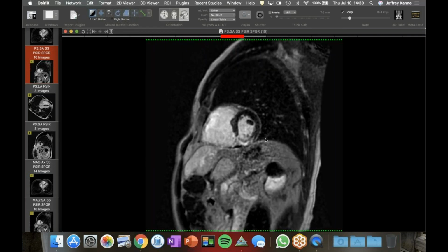So it's both on the pulmonary arterial side and the systemic arterial side. And that was a thrombus on the right atrium. So this patient had been on anticoagulation for a long time. So even with that, they're still prone to thrombosis. And not just pulmonary embolism, but also systemic arterial involvement as well.